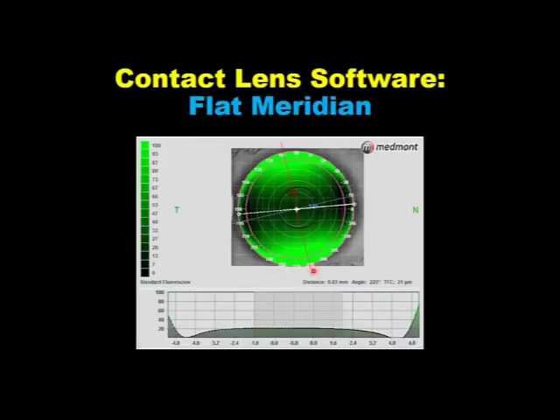Now another way we could approach this is to drop a contact lens on the eye, use the contact lens software and build a theoretical fluorescein pattern. So you notice your contact lens with your green dye underneath it, or theoretical fit. And what we might observe is the actual tear film across this line. So focus less on the contact lens and more on the graph down below.